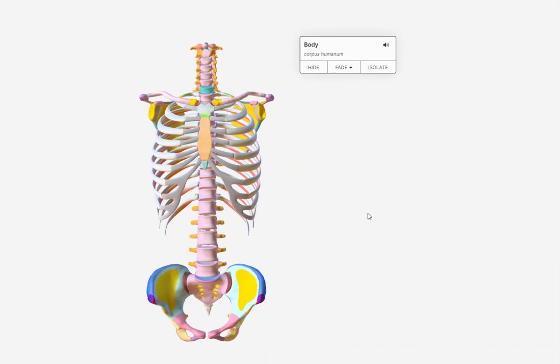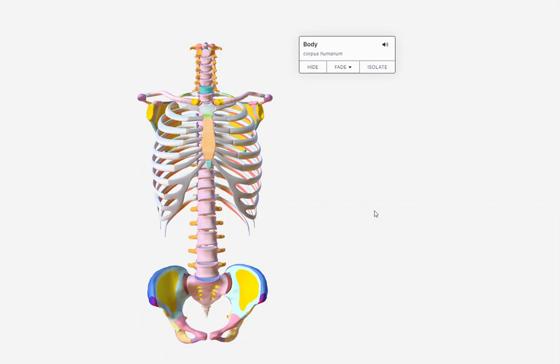All right, so I hope that this was helpful, just kind of identifying the different oblique positions and seeing how the anatomical structures are going to change. The way that they look and the way we identify the anatomical structures will be different when we start rotating the patient into different positions, whether it be lateral, obliques, AP, or PA. We'll see some differences going on in the different parts of anatomy.